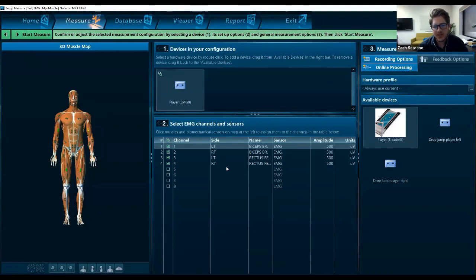This is going to save to this particular configuration, and so every single time that you use this measurement configuration, those same processing settings are going to be applied to the signals. And again, that just helps with the efficiency of the overall workflow. Allows you to not have to worry about going through and applying all of the same processing techniques to every single recording after the fact.